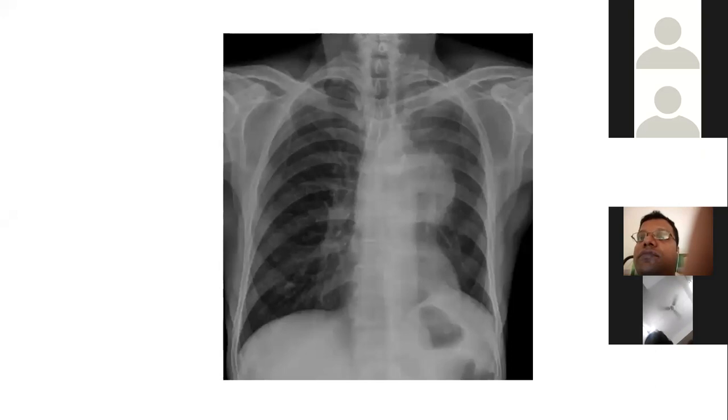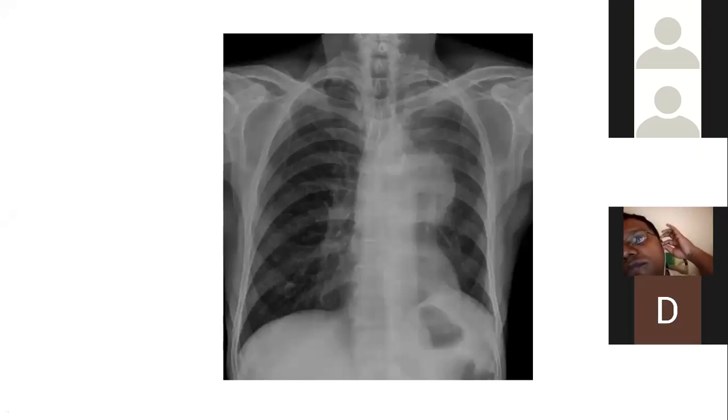So yeah, this is the third one. So what can this be? So you feel it's a mediastinal mass, right? So yeah, why did you say so? Why do the majority of you feel it's a mediastinal mass? Broad based towards the mediastinum. Okay, that's nice.